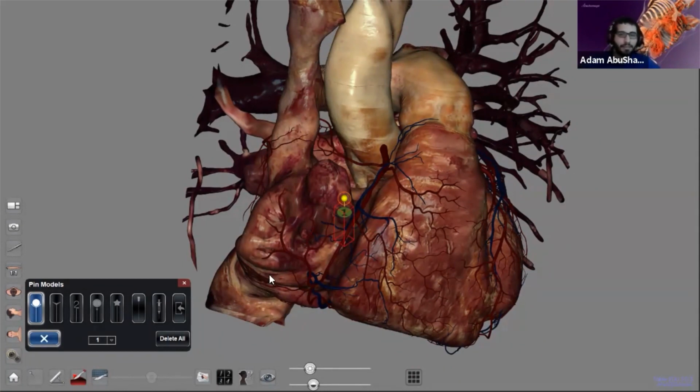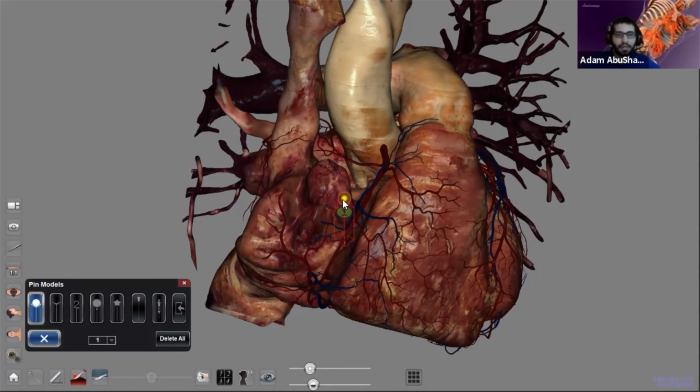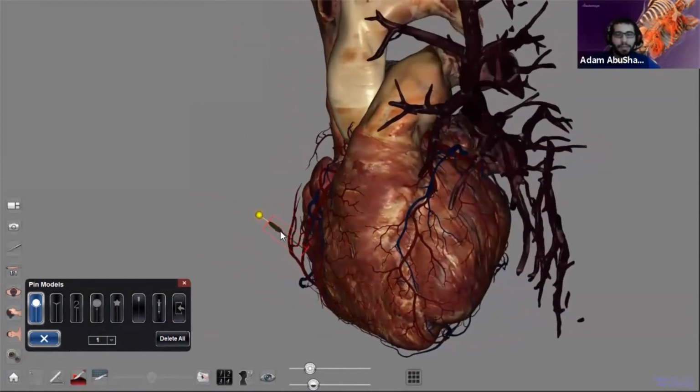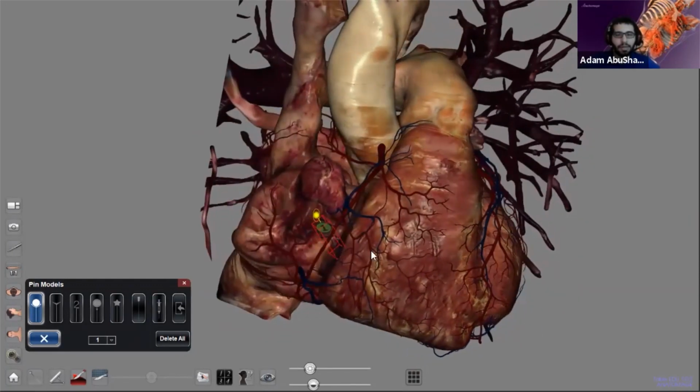If you haven't seen the pin tool used in action, the yellow ball allows you to spin the pin around, while clicking or tapping on the red box will allow you to translate the pin through the table space. So you're going to have to manipulate your view a bit to make sure you're getting it exactly where you want.